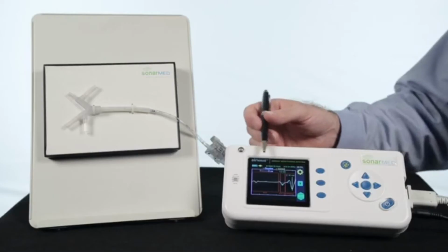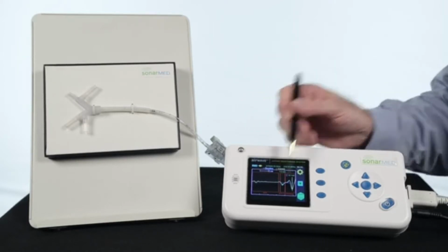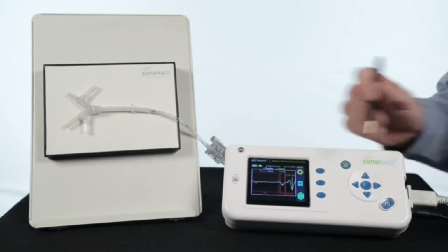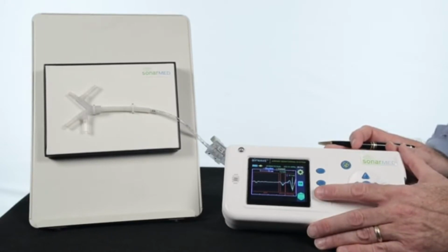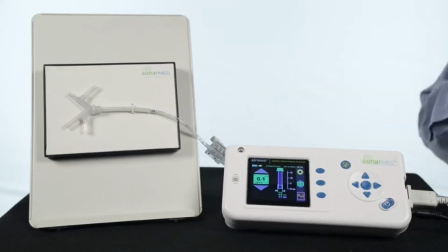And that covers the waveform function of the monitor, the airwave movement through the endotracheal tube itself, at the tip, and then in the lung cavity at the far end. To get back into the regular monitoring, you simply hit the icon or the button to the right of the lowest icon, and it'll take you right back to where we were monitoring originally.